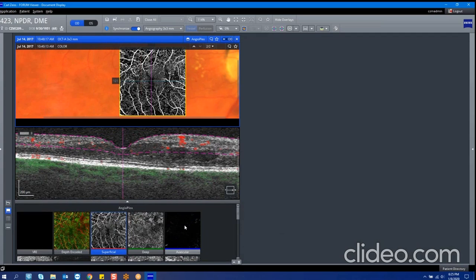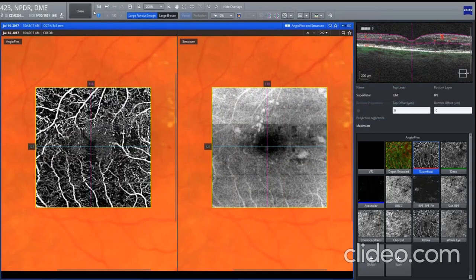That's pretty much it. There's a few other features up here on the toolbar, but as far as your basic use of Retina Workplace, I don't want to make it any more complicated than it has to be. Is there anything in particular that you're interested in that I didn't cover, or any questions at all? No? Okay. Well, that's basically it now.